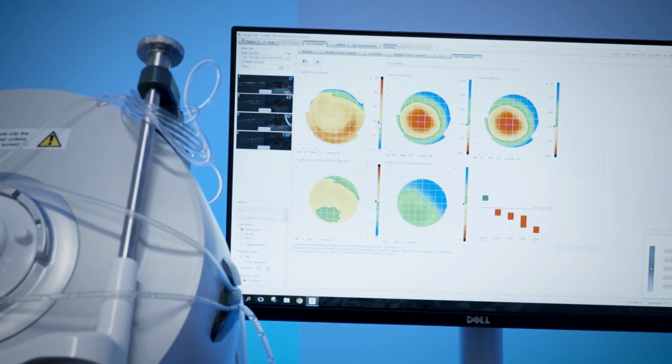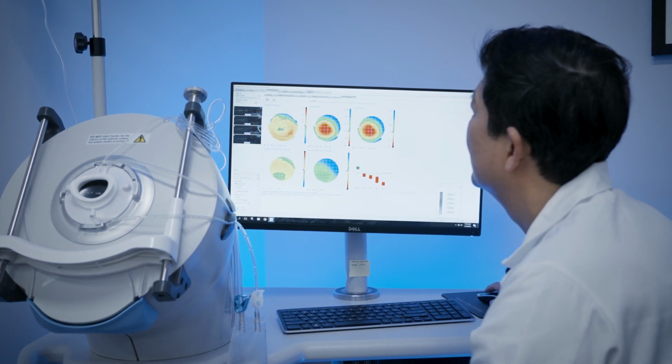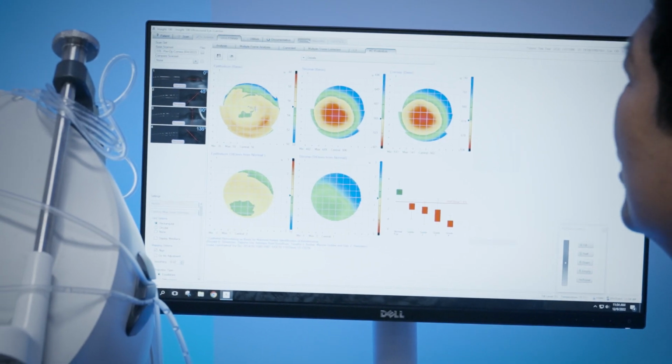So what I do is I adjust this so that the first area in the area of relevance, it turns green. Okay, so right here is where we're seeing the green first indication. So I look at it as like 55 versus 55.4, 55.6. There's really not much of a change here.